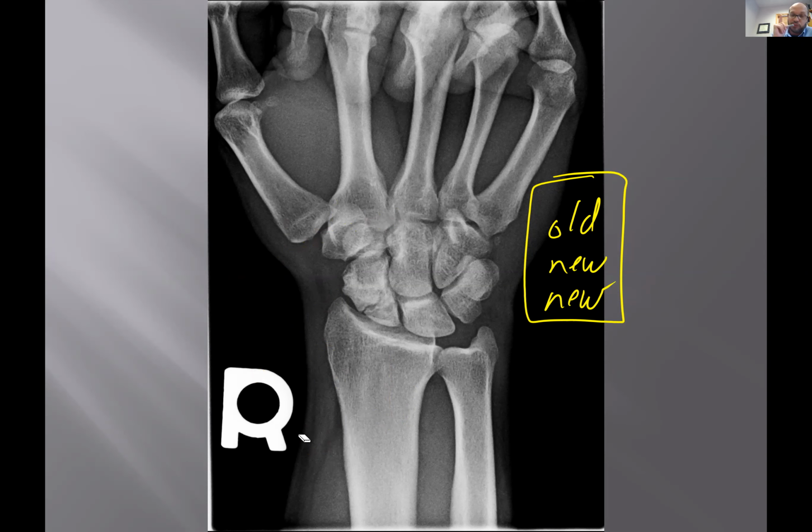And this is the most common fracture of the wrist, but it's also the most commonly missed fracture in the wrist. So, subchondral cysts with degenerative joint disease, and the most common wrist fracture, the scaphoid fracture. Questions on this case, guys and gals?